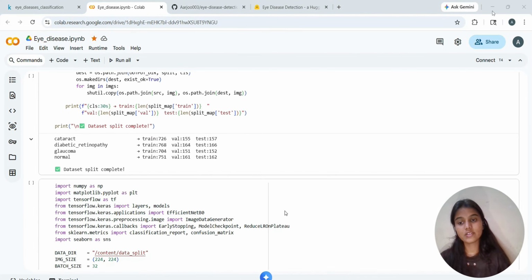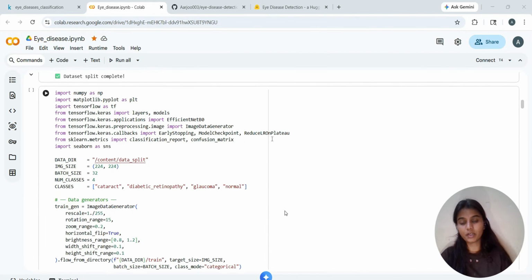The training phase is just like a textbook. AI studies these pictures over and over to learn what the disease actually looks like. After that, in the validation phase, while the AI is learning, we use these pictures to see if it's just memorizing the pictures or if it's getting better. The testing phase is like the final exam. We put in new, different images which the AI has never seen before, and here we see whether it works properly or not.